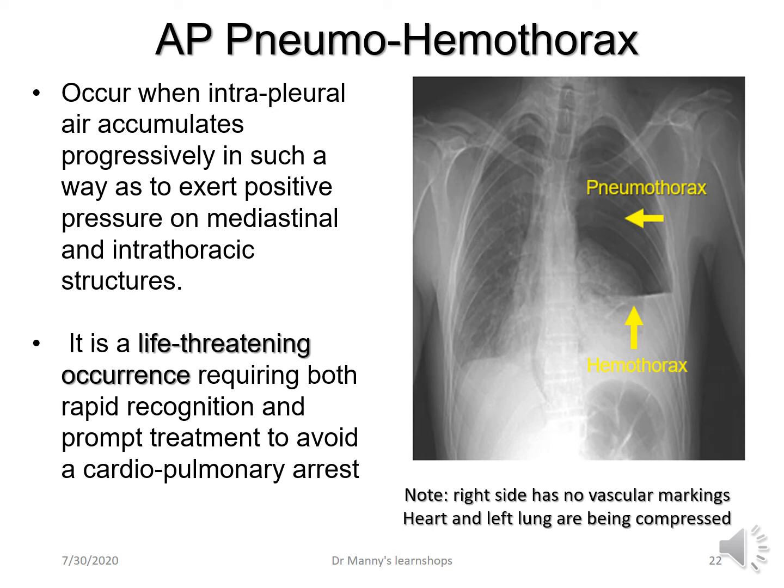So if I told you here that this patient was a chest trauma with contused lung, fractured ribs, this would explain the bleeding in the chest and the accumulation of blood in the pleura. So you've got a combined pneumothorax, air, increased radiolucency or blackness on the left side, in the left upper lobe, and you've got a hemothorax, increased radioopacity, whiteness, in the left lower lobe.